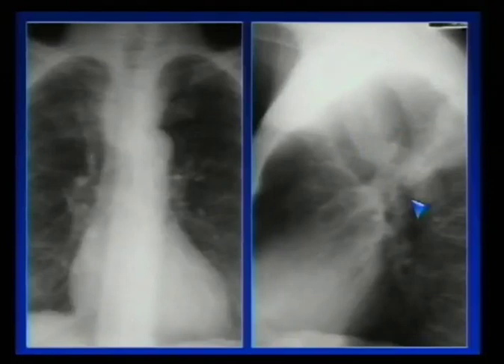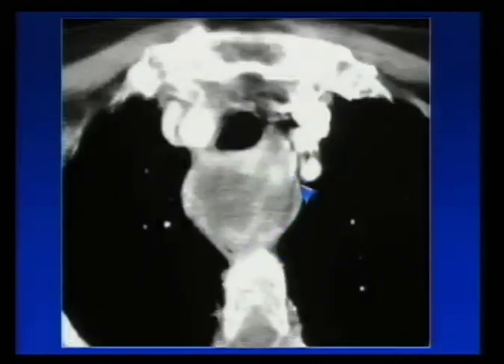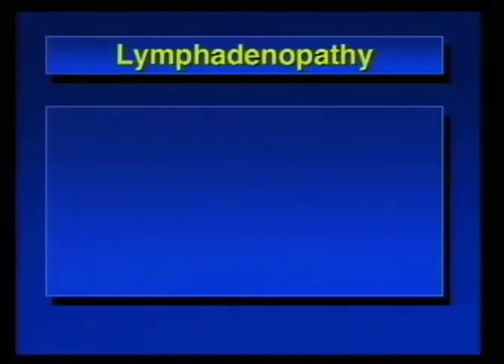What could this be? It could be lymphadenopathy, such as from what? Metastases, lymphoma, sarcoid. The other thing to consider, mediastinal cysts, such as a bronchogenic cyst, or as in this case, what is this? There's the thyroid gland here and here. This is contiguous with the thyroid. It's heterogeneous. Coming down inferiorly, we see how heterogeneous it is, and it's posterior to the trachea. Goiter in the middle mediastinum. Let's move on.